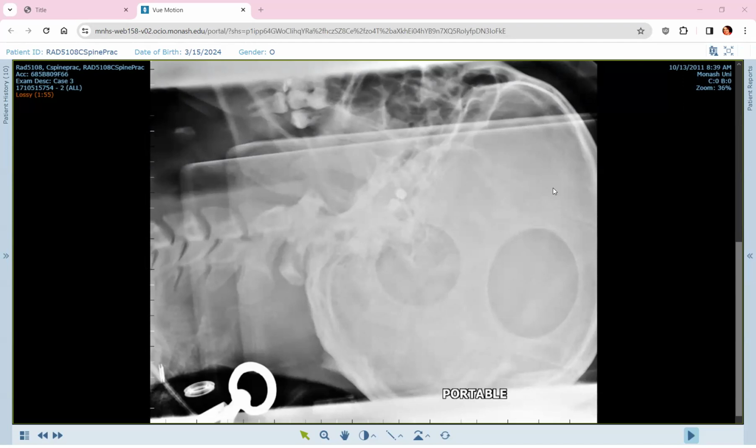The next case is that of a patient who was in a high-speed car accident. And there are two views of the lateral, and it just shows that sometimes it's really tricky to get decent x-rays of the lateral view, especially when a patient's neck might be in spasm or they might have broad shoulders. So the first image is of the top part of the cervical spine, and that appears fairly normal. There doesn't seem to be any issues around alignment or any evidence of any fractures there. Let's just have a look at the second image.